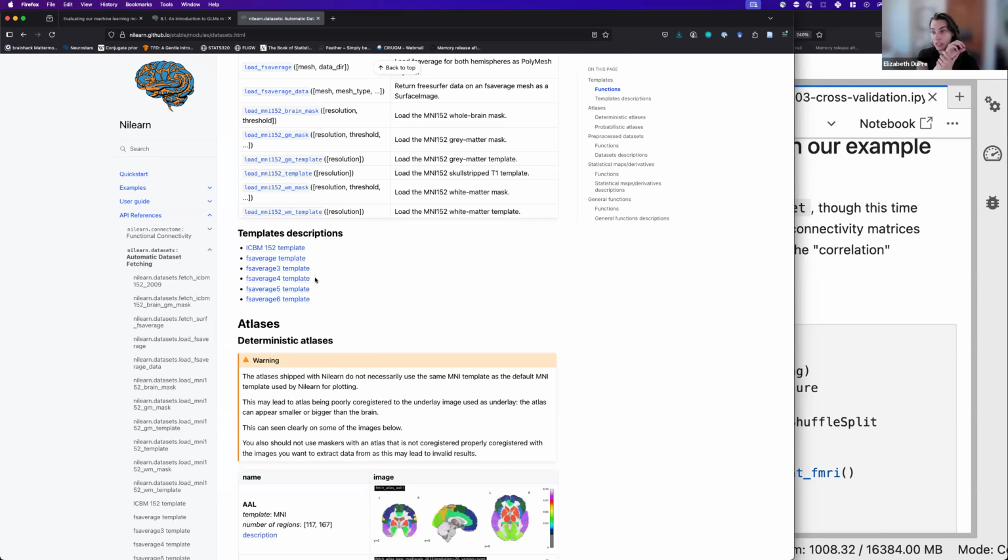Instead, I'm going to learn from the data what those regions should be, and then learn the transformations within the parcellation that I've learned. In other cases, maybe I want to make inferences in particular regions of interest and map them out to the literature. In those cases, I would use an atlas that someone else defined that I found has been really helpful for conceptualizing activation in particular regions that are linked to, in my case, something like movie watching.